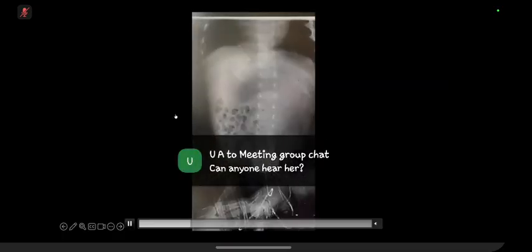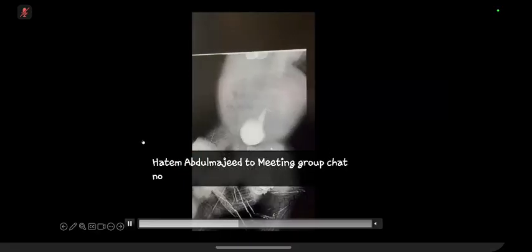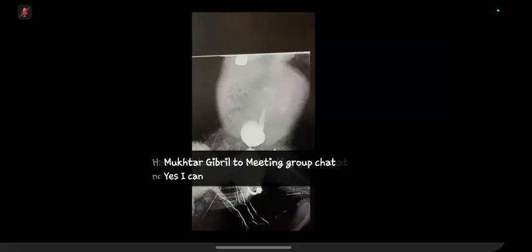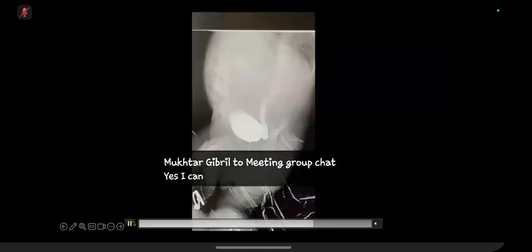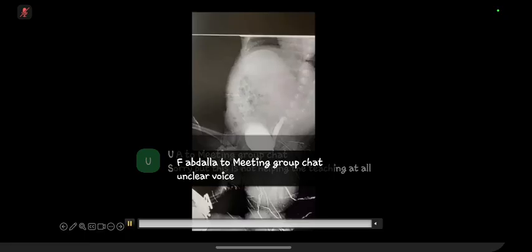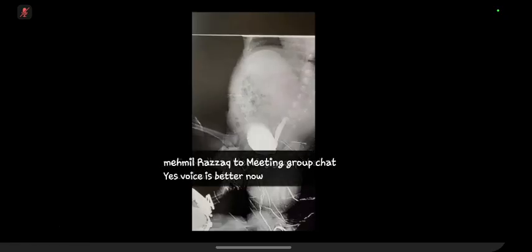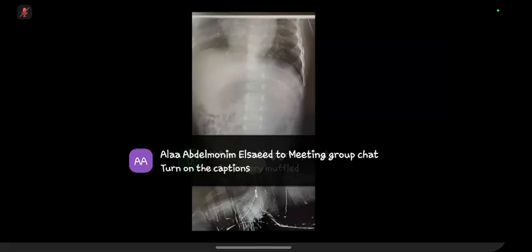I would check the entire series to trace the contrast column, whether it reaches the renal pelvicalyceal system or not, as that will change the grading for me. In these images, the ureter has some tortuosity in its mid part. So if the contrast reaches the pelvicalyceal system and there is dilatation and clubbing of the renal calyces on the ipsilateral side, this signifies grade 5 vesicoureteric reflux with a dilated and tortuous ureter.